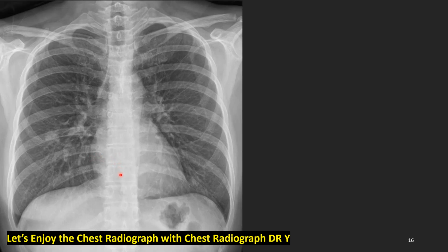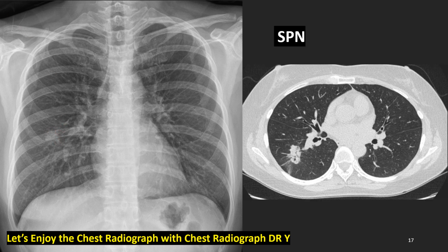What do we see with this young lady's frontal chest radiograph? She's a never smoker and very young. Yes, this nodule here, below the minor fissure, so it is not in the upper lobe, maybe in the middle or lower lobe. This is the thin section CT, solitary pulmonary nodule of the right lower lobe. Doesn't this nodule look like it just evolved from a subsolid nodule to a solid nodule? For me, it looks like that, with intratumoral air bronchograms. Do you concur? Interesting.